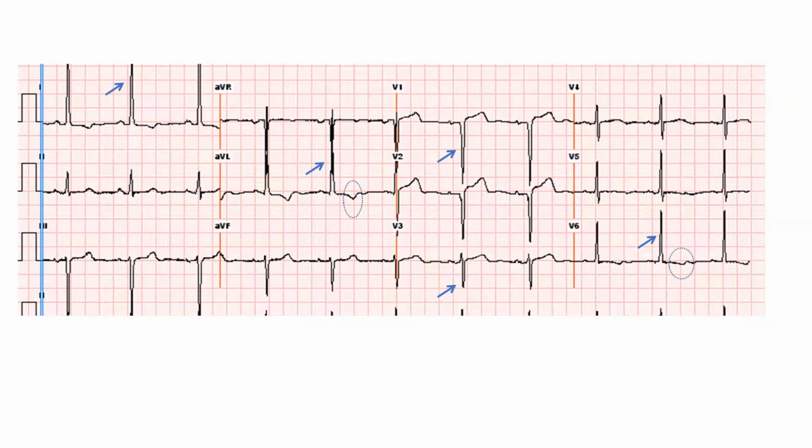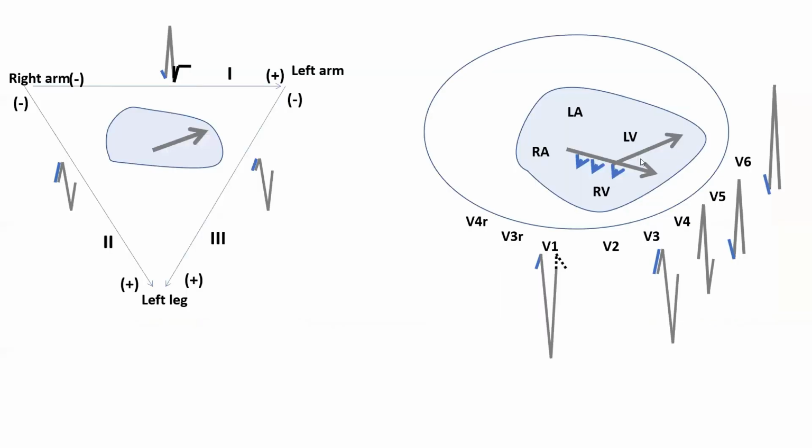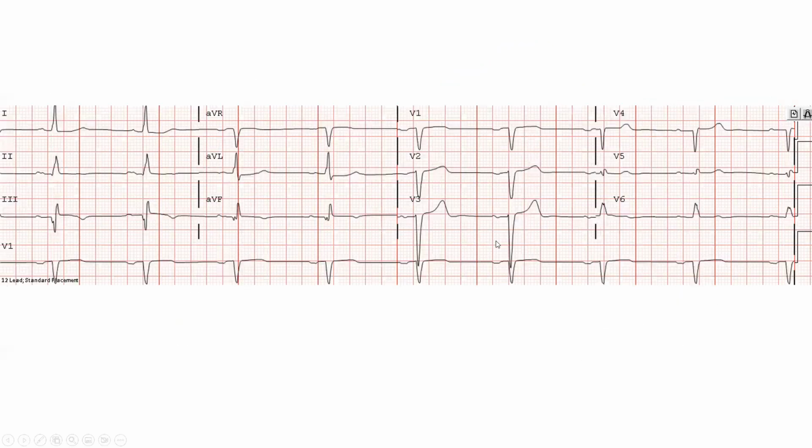But at one point, you can even lose the R depending how far the heart axis of depolarization is from that V1, V2. This one, on the other hand, this is poor R wave progression, very poor R. You see R in V2, V3, it's extremely small. But then, conversely, as you progress, you're having a full-blown Q wave in V4.